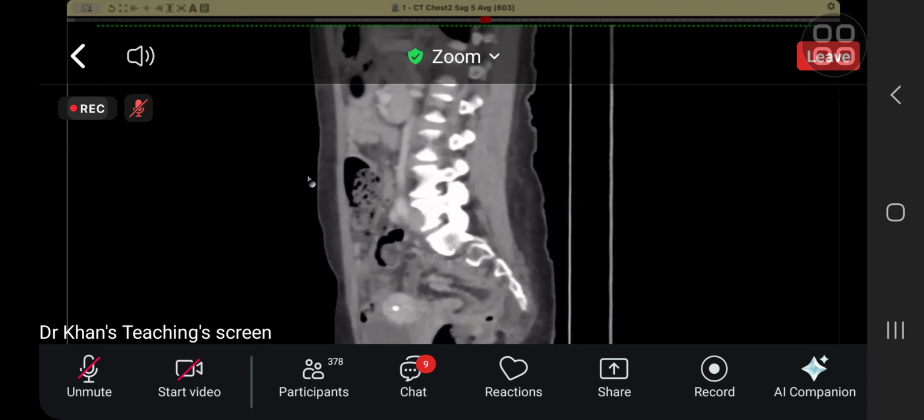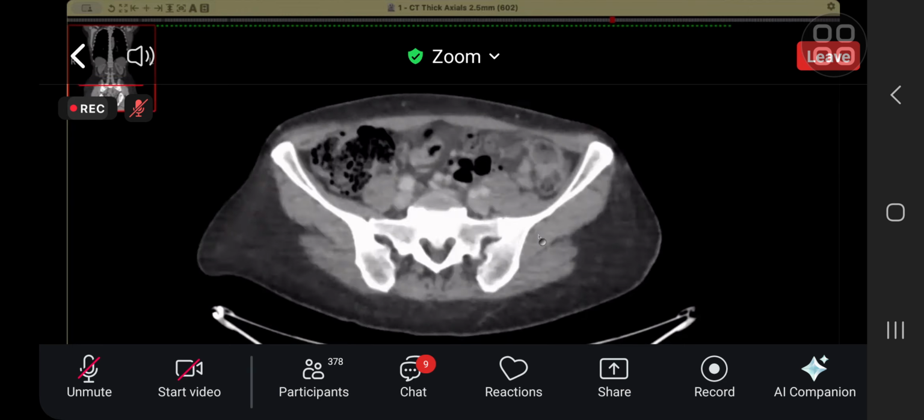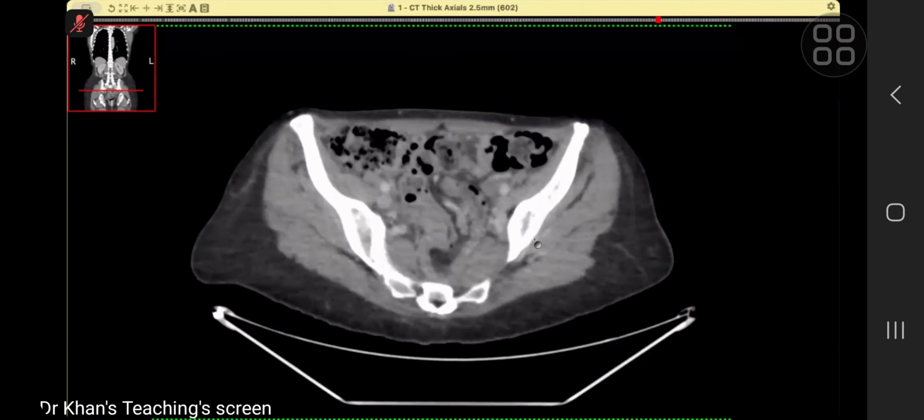Well done, candidate 2. You picked it up beautifully. So well done once again. Thank you, sir. Now, if you see here what is happening, something is wrong in this region.